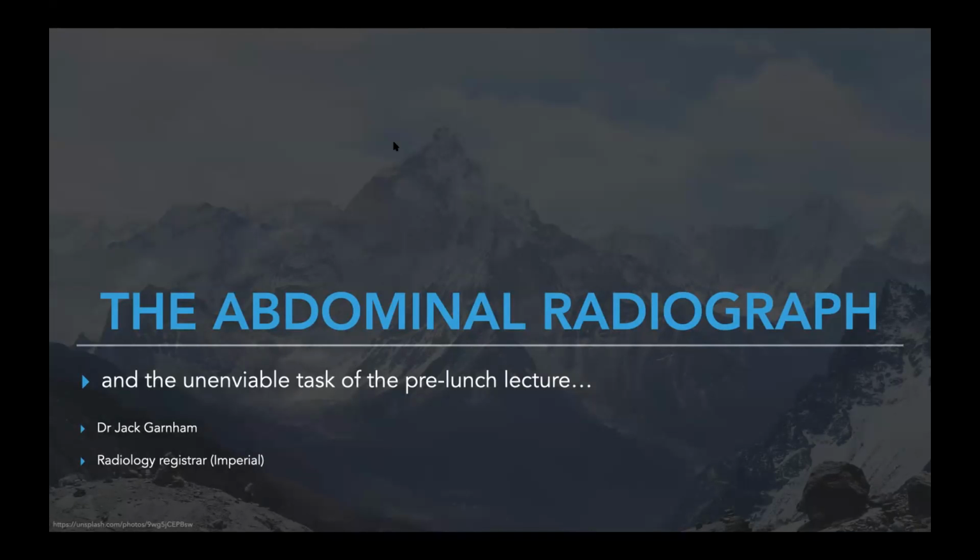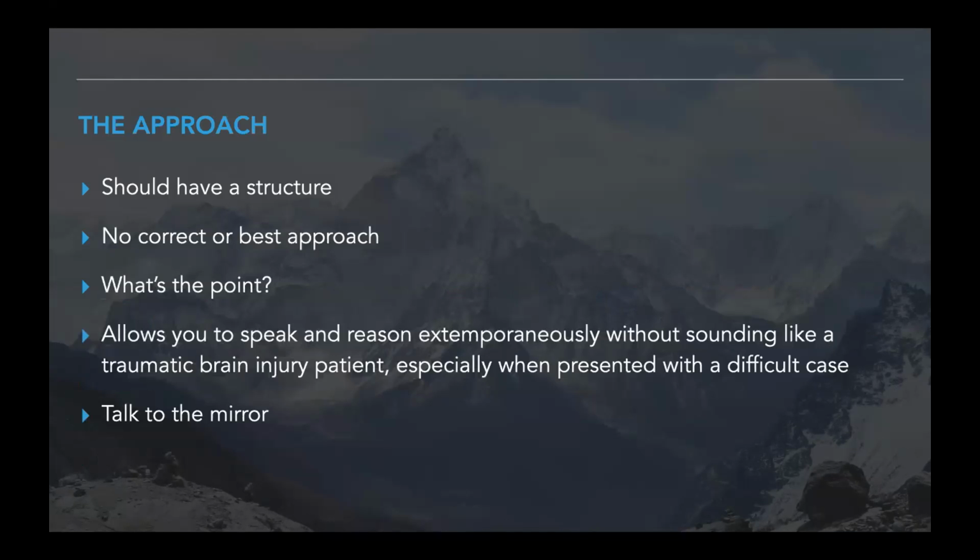I've been asked to talk about the abdominal radiograph. I've kind of pitched this at final year students preparing for finals. So for those of you who are a little bit more junior, this might be more complex than you'd like, but just bear with me if you can.